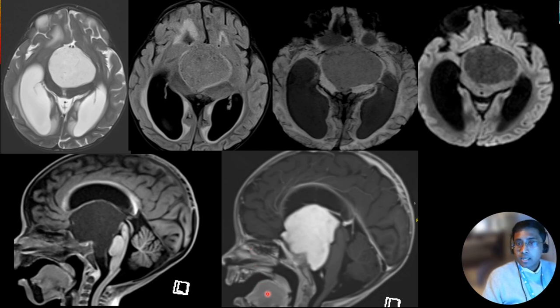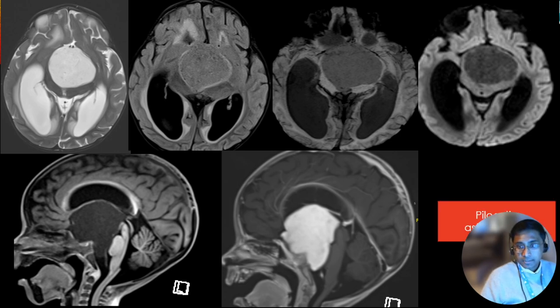Just to tell you that intense post contrast enhancement does not necessarily mean a high grade tumor in the pediatric population. That is very important to remember. So we can have tumors which intensely enhance, which are low grade, and at the same time we can have tumors which restrict and do not enhance, and they are high grade. So that is very important that you remember this principle in pediatrics.